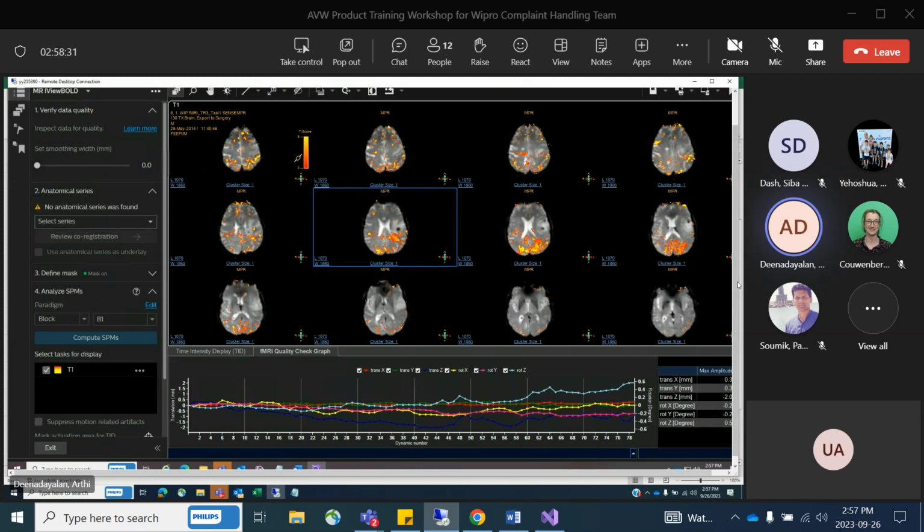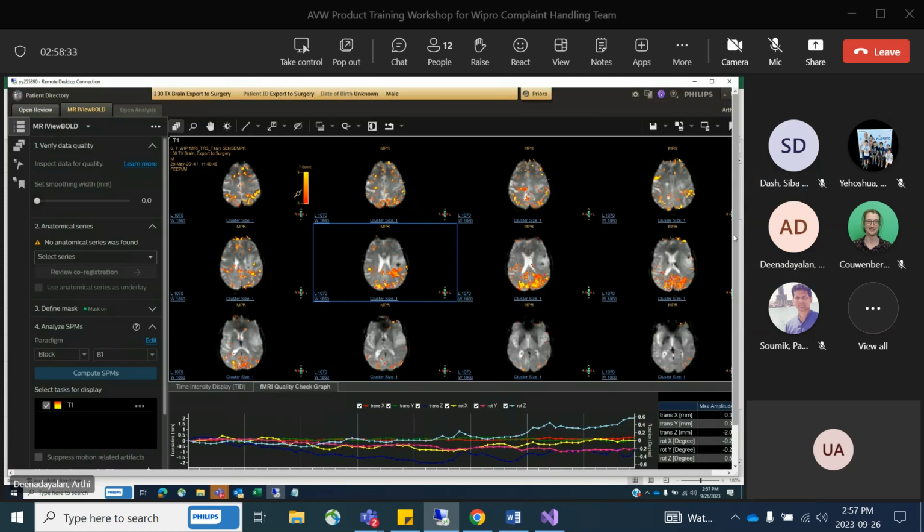Once this is done, in the same way you can have the basic operations like save, film, report, bookmark. The same way as what I did on MMV, if you save it, it will be displayed on the PD as well as in your PI. Your film, if you want, I can do it and show: film, send screen, send selected.